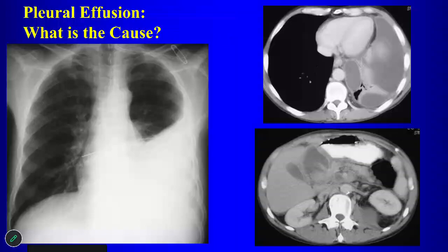Well, look at the liver. I mean, we have these hypoattenuating lesions here. Then maybe that's maybe four. Well, what do we think this is? Oh, gallbladder, what do you think that is? Pseudocyst of what? So what are you thinking about there? Pancreatitis, yeah. So this is a patient who has a cystic structure next to the pancreas, maybe a pancreatic pseudocyst.